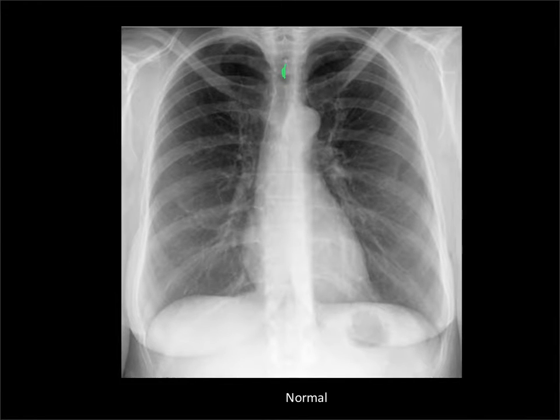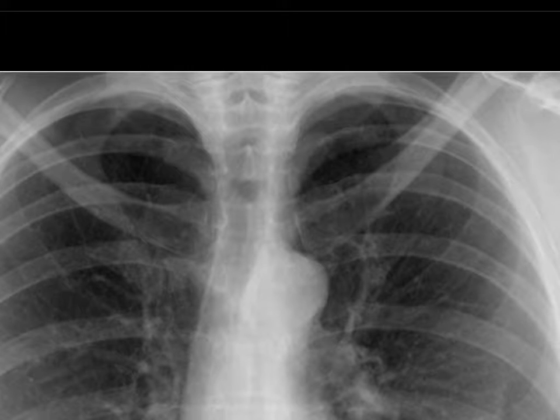No prizes for guessing that this is the trachea, but you'll see that there is a thin stripe of soft tissue, shouldn't be more than about 5 millimeters thick, that lies between the trachea and the lung coming in. I'm going to zoom in and erase my lines in just a minute. And there is a similar but thicker one on the left. So the line I'm talking about is this one here, and it is the right paratracheal line or the right paratracheal stripe.